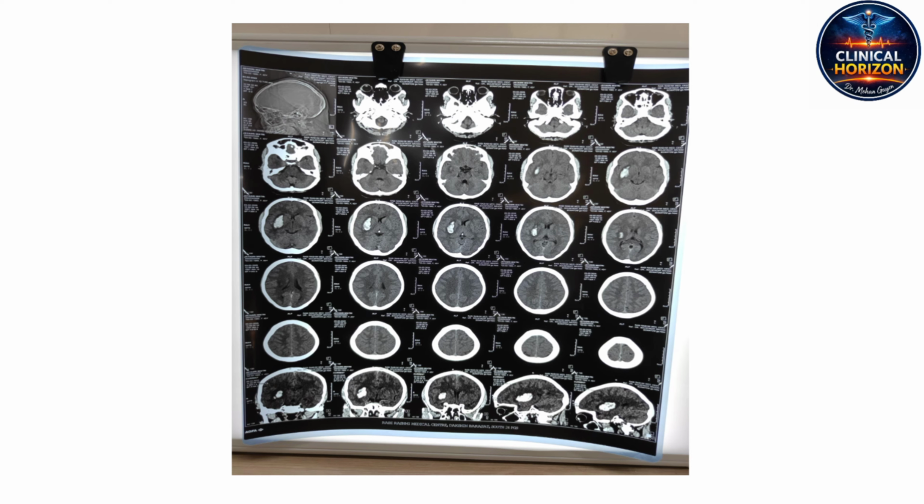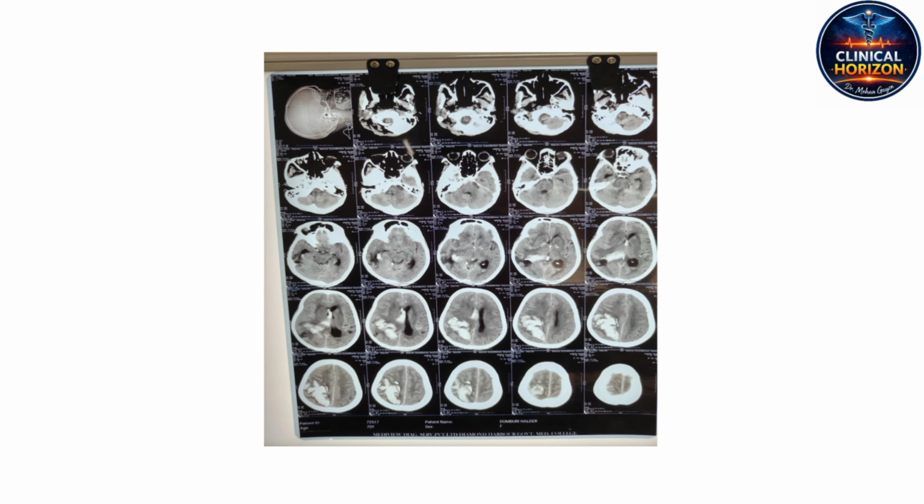Exactly. Now, that isolated bleed is a stark contrast to our next demonstration scan. This shows a catastrophic failure of the same system. Here we see a massive hyperdense hemorrhage. The sheer volume of the extravasated blood is staggering. And that hypodense halo of edema is aggressively expanding. It's taking over. We are looking at a severe high-pressure crisis dictated by the Monro-Kellie doctrine.